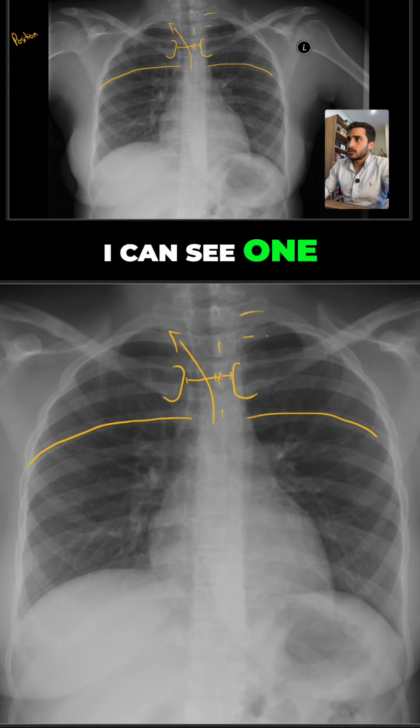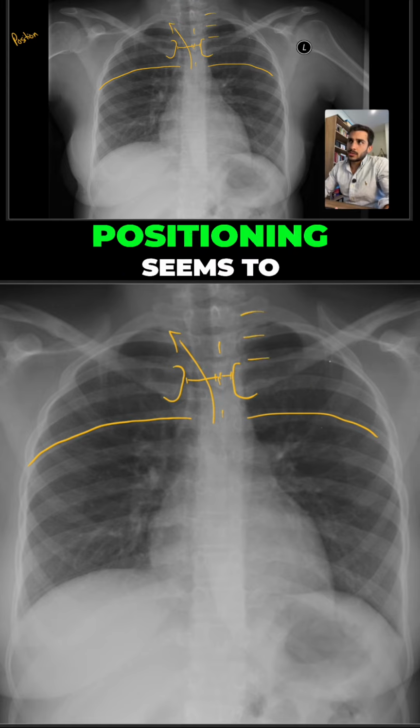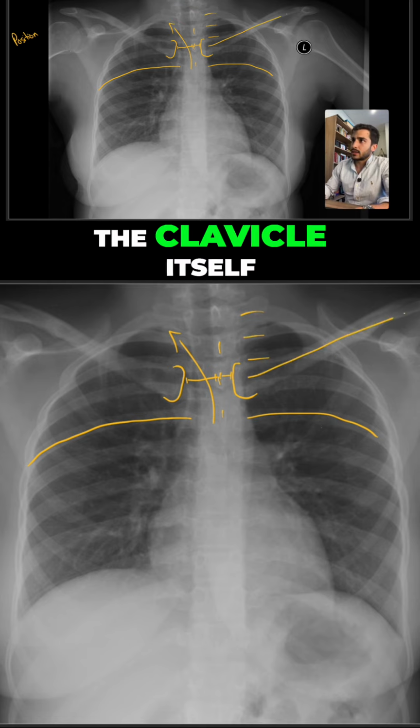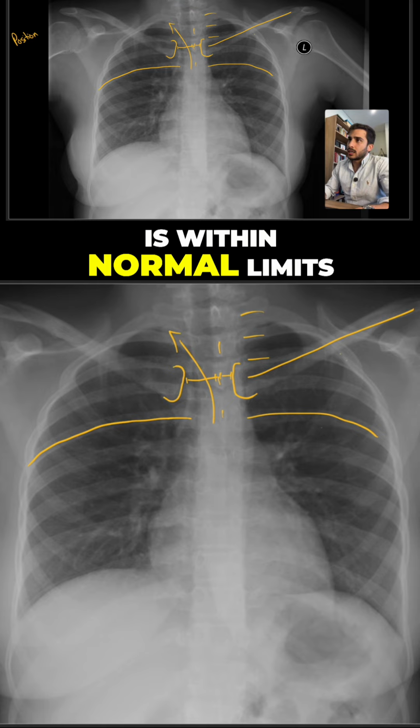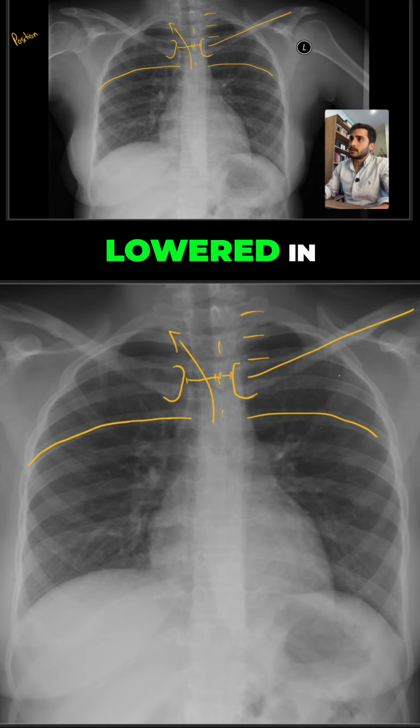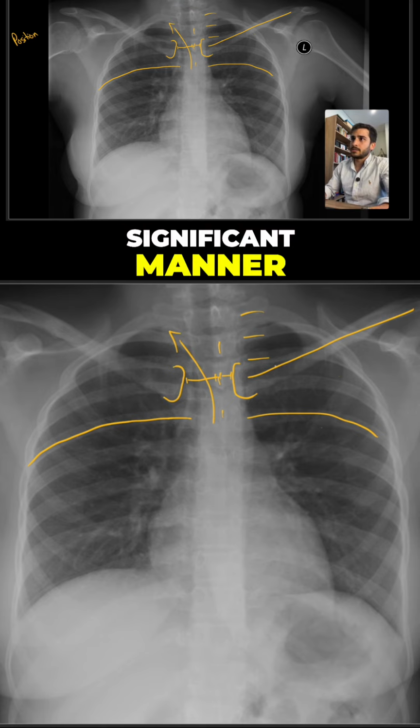Again, I can see 1, 2, and roughly 3 ribs above the clavicle, so the clavicle positioning seems to be in an okay position. The angle of the clavicle itself is within normal limits, so I wouldn't say the shoulders are necessarily raised or lowered in any significant manner, and there doesn't seem to be much kyphosis or lordosis in that manner.